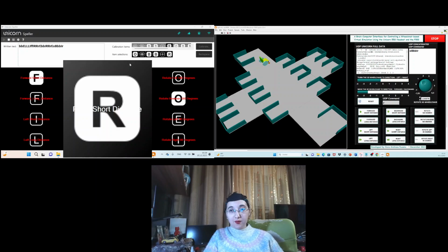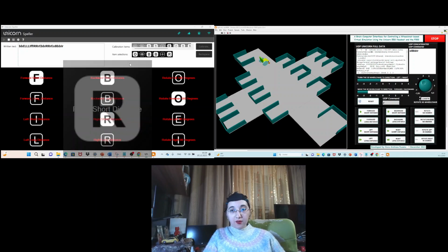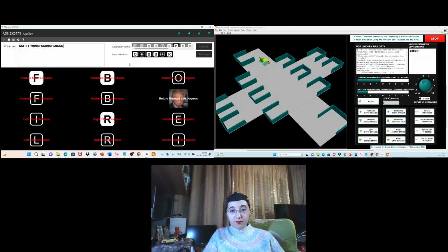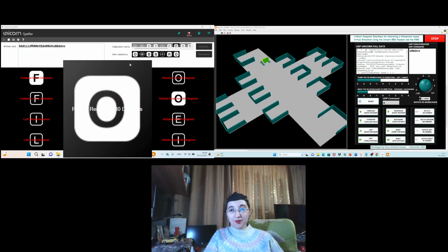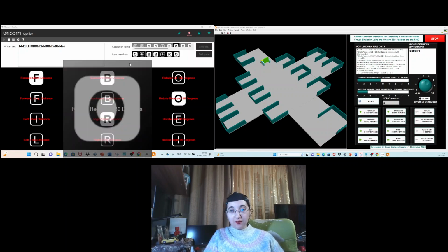Perfect. 6 commands already correctly detected. Rotate reverse 180 degrees now. Yes. Okay, we have 7 commands.